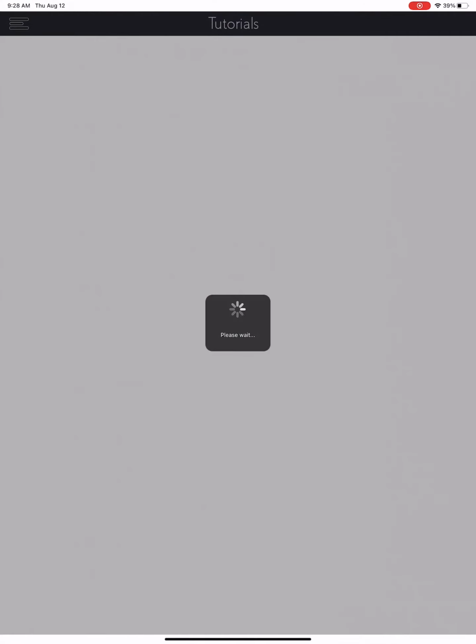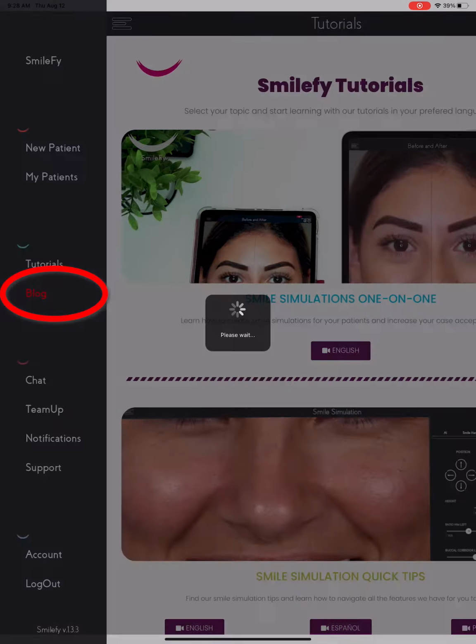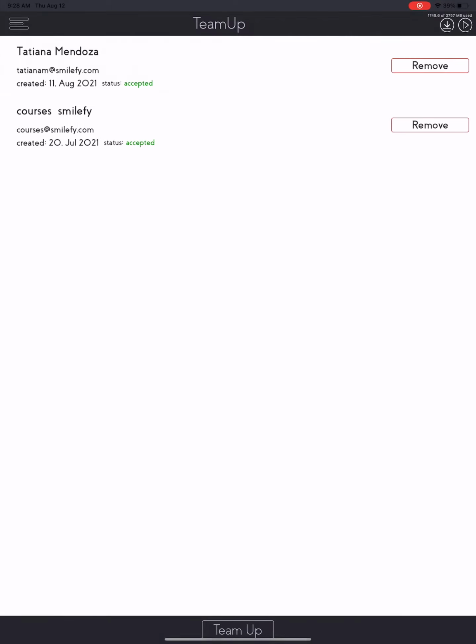We have tutorials that will help you perfect your designs. Blog, where you keep up to date with what's new in digital dentistry. Team Up, share your cases with other SmileFy members and draw up multidisciplinary treatment plans.